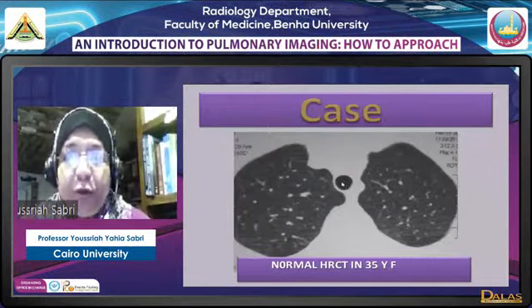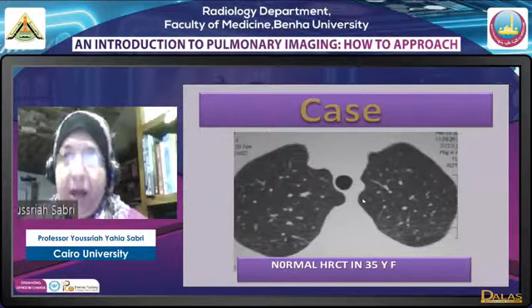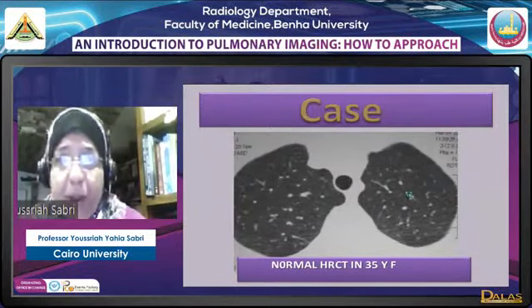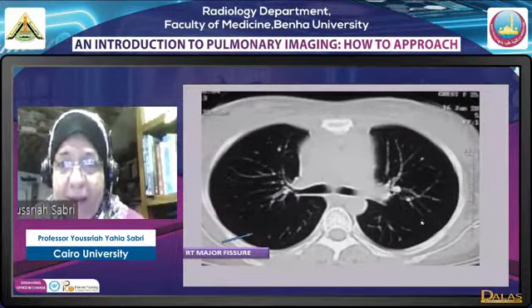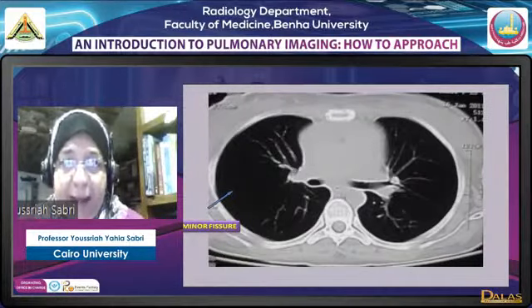الحاجة الثانية I should compare the lucency of the trachea to that of the lung. Both are black, but there is a discrepancy in the blackness. لو اللنج نفس اللوسنسي بتاع التراكيا this means I'm having a hyperlucent lung. ده في الهارزوش. طيب بعد كده الفيشرز مهم جدا، ده conventional CT study. الميجر فيشر بيبان كباند of avascularity, while the minor fissure will show as an area of avascularity.